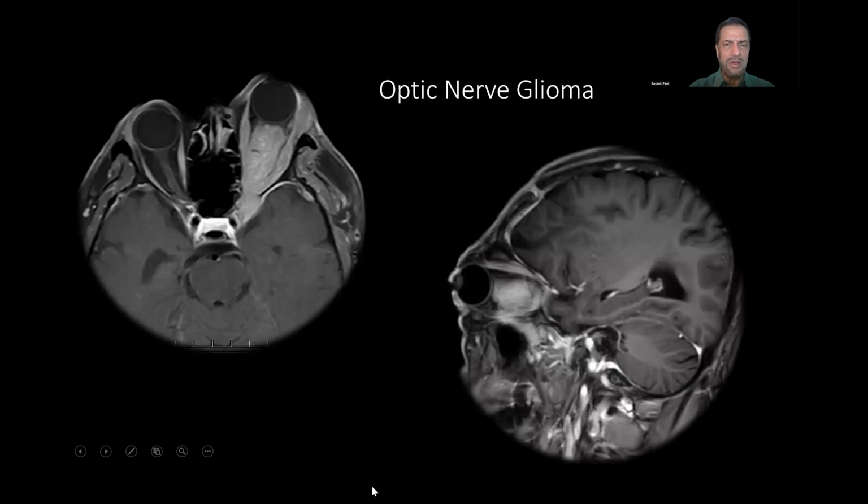Now, coming back to a not very common pathology, but sometimes you see in this image that the eye is proptosed, coming out of the socket, and there is a tumor involving the optic nerve, through the optic canal into the intracranial structure as well, almost to the foramen. So this is an optic nerve glioma. Probably the patient is already blind on that side. But most of the time, optic nerve gliomas are pretty benign tumors. So once you remove it, they do pretty well.